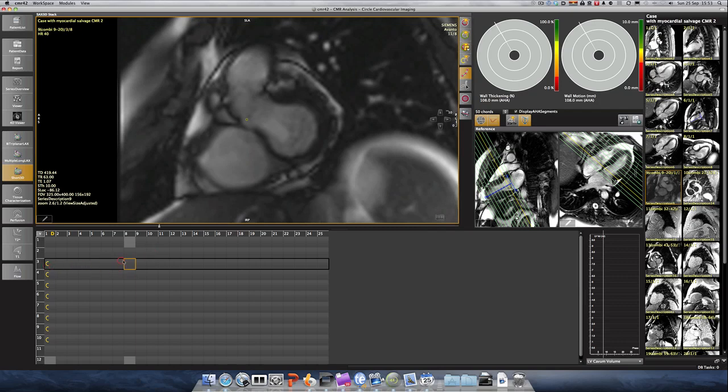So first of all, if this is our first slice, this is also slice 3, where systole might actually contain some ventricle, and we've looked at this. I think this is the right atrium in systole, because again you've got some longitudinal shortening of the right ventricle, normally about 2 centimeters. That's what echo measures as the TAPSE. So it would be almost strange and would suggest really poor RV function if you still have the RV in the same plane in systole.